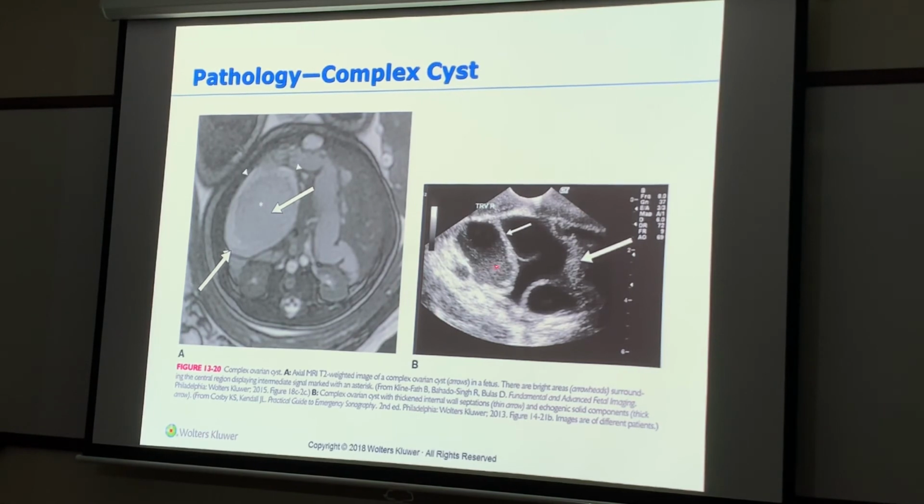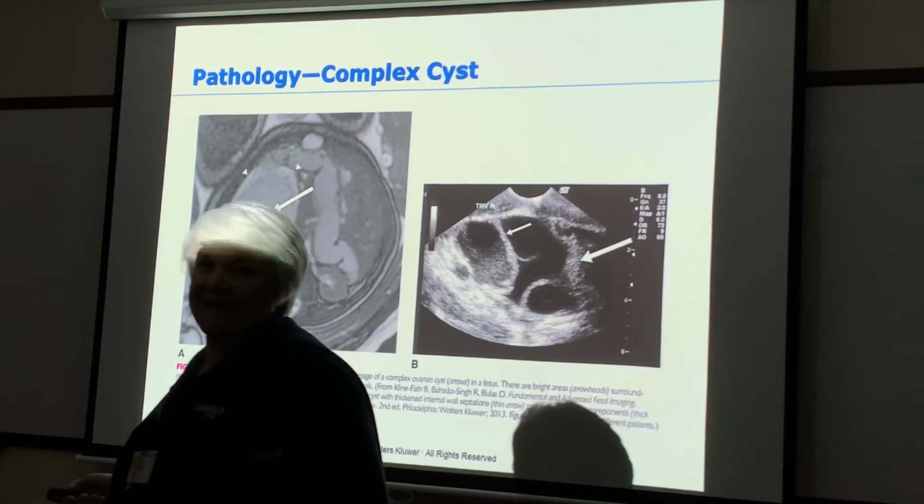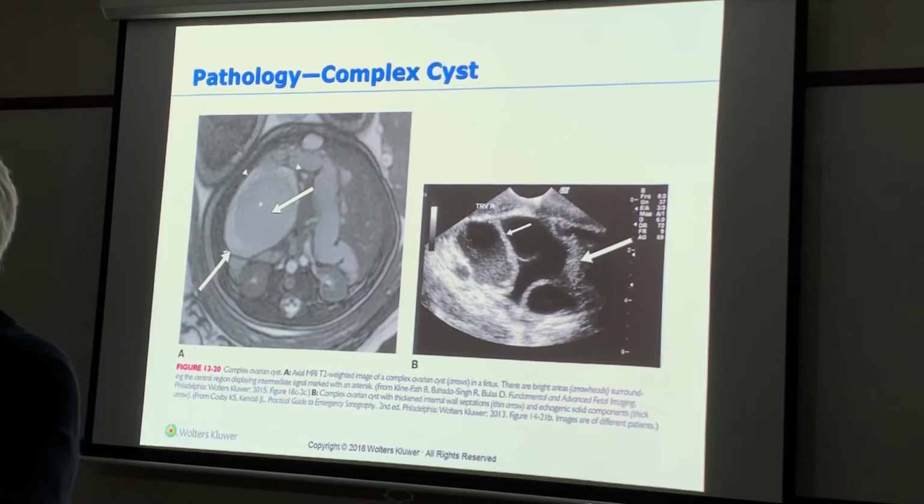This is also a hemorrhagic cyst. One of these cysts has bled. If my patient is going through infertility, what is this called? That is called hyperstimulation.